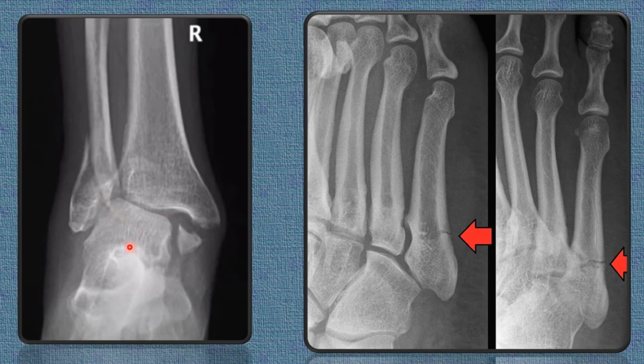So this might be inversion, meaning when your foot is turned towards the medial side. Eversion means when your foot is turned outside. So this is most probably the eversion injury, and the ligament which is attached on the medial malleolus has been stretched. So this part is sloughed off, where pressure has also occurred on the lateral ligament. That is why this part is fractured but not fragmented or sloughed out.